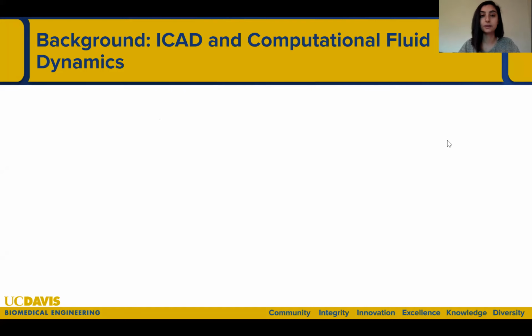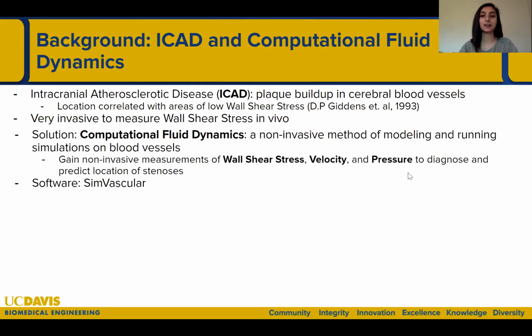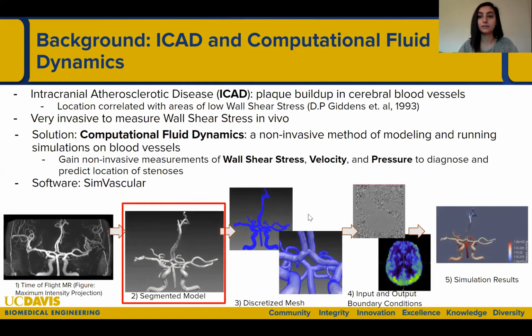ICAD for some time. A solution to this problem is computational fluid dynamics, a non-invasive method of modeling vasculature from imaging data and simulating blood flow. We can use CFD to gain non-invasive measurements of wall shear stress, velocity, and pressure to diagnose and predict locations of ICAD stenoses. Here we see a pipeline of running such a simulation in SimVascular.